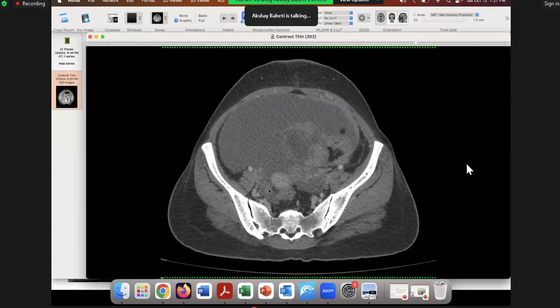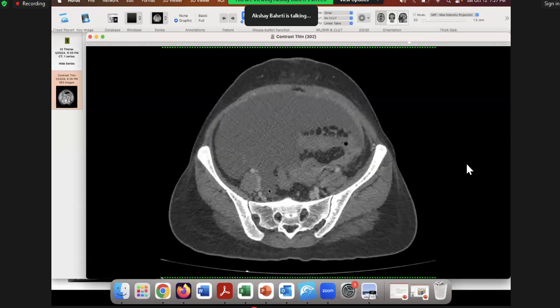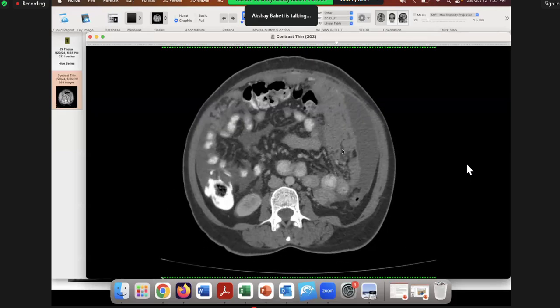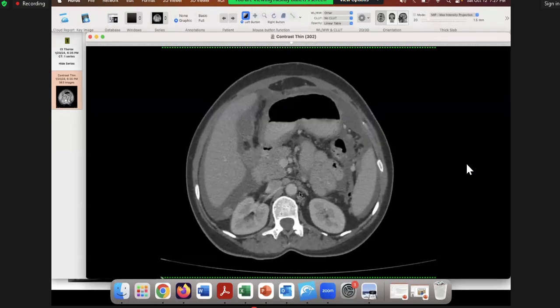Okay. Fine. So there are bilateral adnexal masses which look pretty solid to me. And there's diffuse peritoneal, omental, and mesenteric disease. Okay. So the impression has to say peritoneal, omental, and mesenteric disease. It can't just say peritoneal disease. Okay. All right. So now, you saw nodes here.